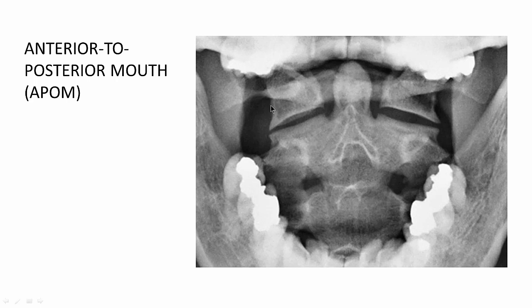The space between, what's this kind of triangle shaped bone here? All this. That's the lateral mass of atlas. Another lateral mass of atlas. Superimposed on it, you can see this coming around, that's the posterior arch of atlas. There's the transverse process of atlas right there. Got it? There's another one right there. Transverse process of atlas. Odontoid of axis, spinous process of axis. Coming off the body, you can see a piece of the body right there.